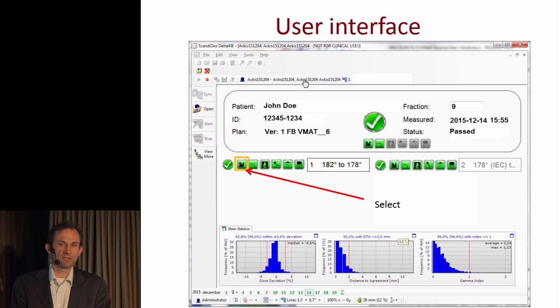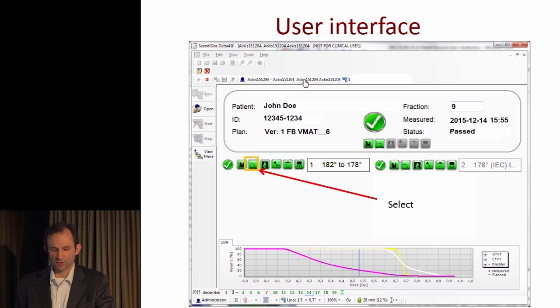And if you really want to dig very deep into these data and analyze it in a very deep way, you always have the possibility to toggle back to the physicist advanced view, and you can do the detailed analysis there. So here are just two examples of how it may look if you press one of these parameter buttons.